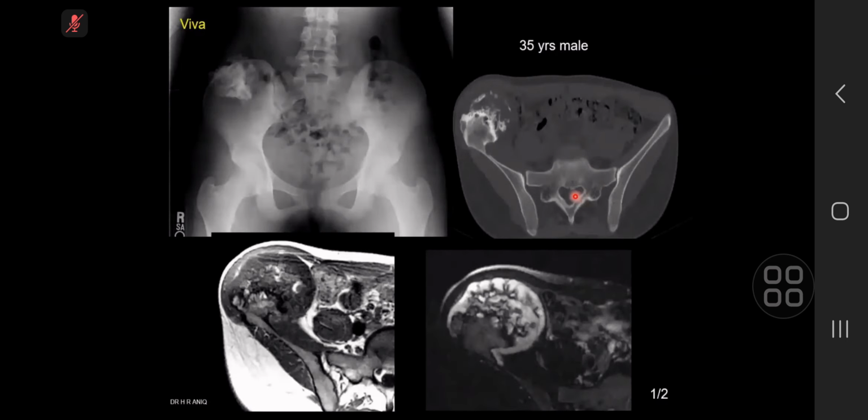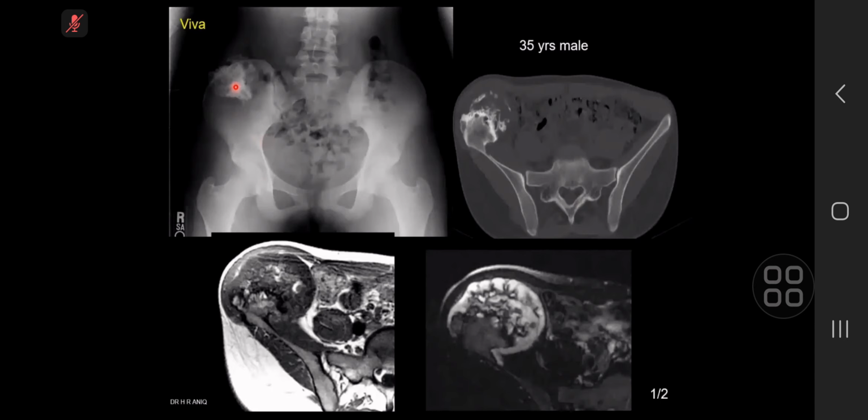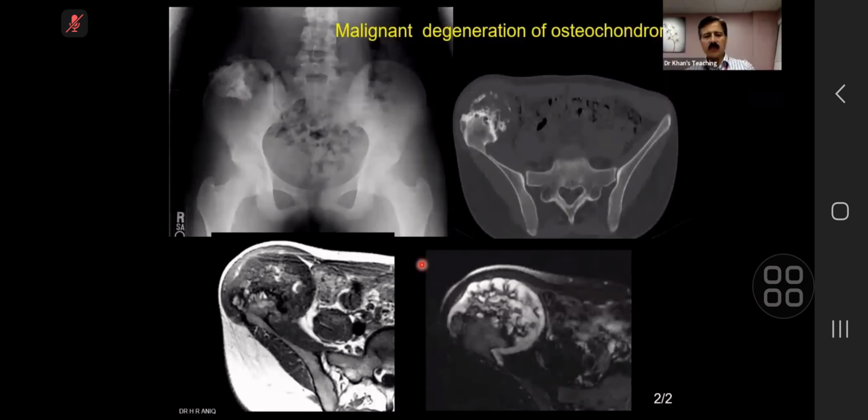Well done. Now, this kind of a case, because of time factor, I put it together. But just a recap, the examiner is going to show this to you, and you will pick up an osteochondroma, and the leading thing might be that there is a bit of pain. CT has got nil role. Don't ask for a CT, right? Ask for an MR. And on MR, this cartilage cap is thickened, means malignant transformation, means bone tumor center referral. So these kinds of cases have come in the exam again and again.